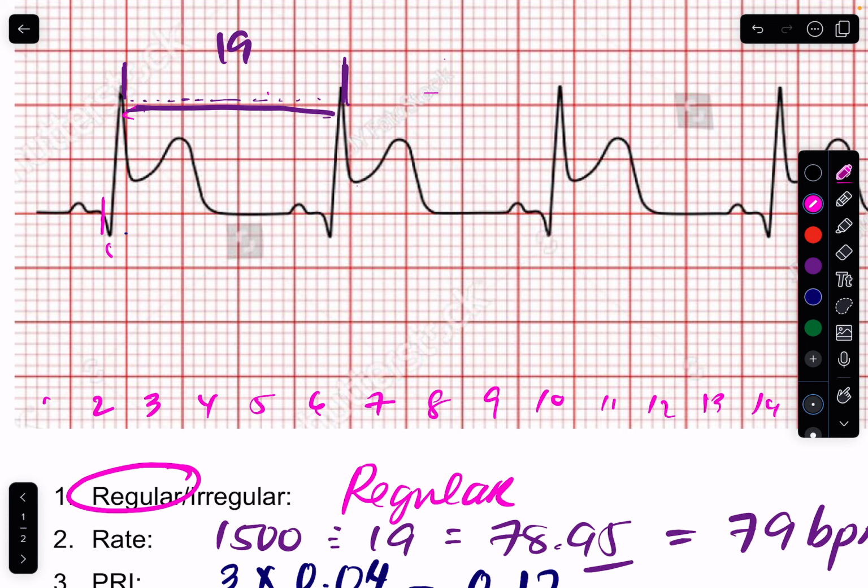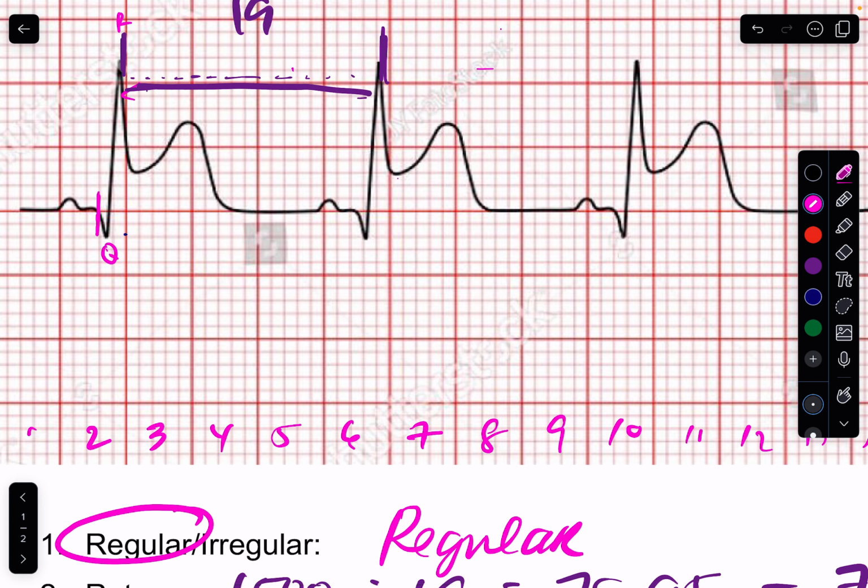So this is my QRS. So I'm going to end here. And this is right where the directions start changing. So this is where I'm going to end. So halfway through this box. So I usually would write. Oh, man. So hard to write on the iPad. So because it's right in the middle, right?